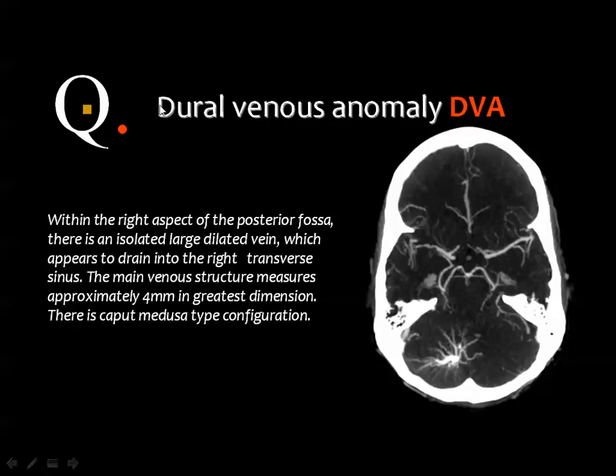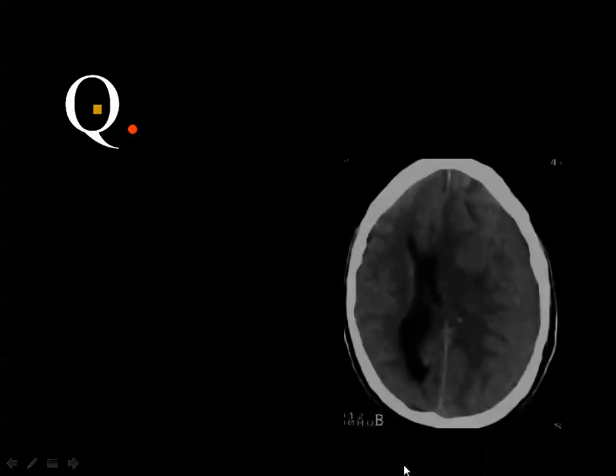The right term is developmental venous anomaly. It is a normal variant, and these veins are draining normal brain tissue. If they are treated as an arteriovenous malformation, they will result in infarction of the area drained by this tuft of vessels.